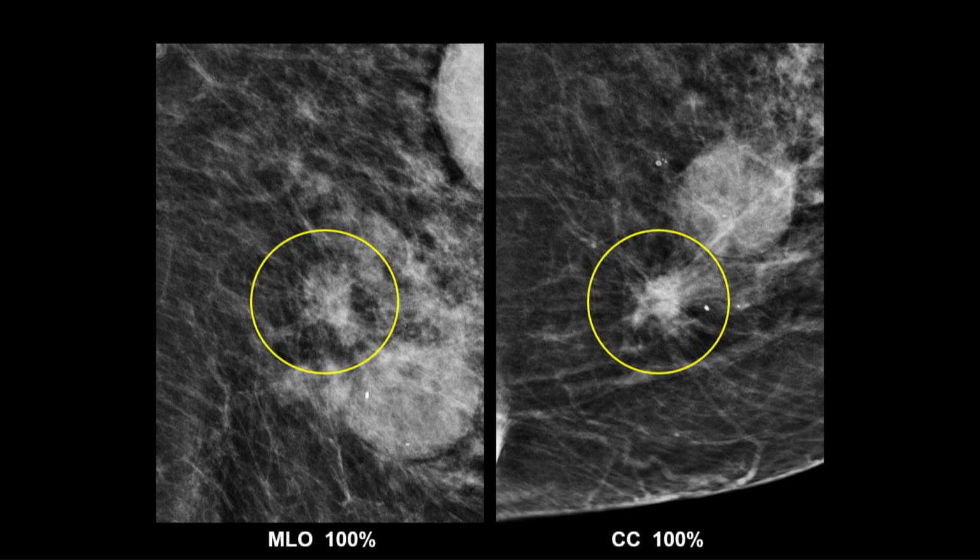And anybody who didn't find this case, that's a very good example of what's called satisfaction of search. You see something and you say, wow, I looked at a whole bunch of normals and all of a sudden they're abnormals, and you look at the really obvious things and you forget to go back and look at something else which might be different.